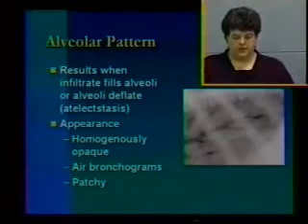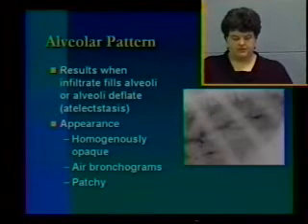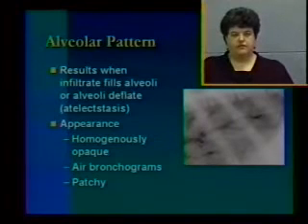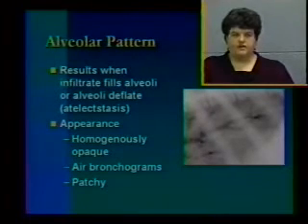Alveolar pattern is probably the easiest to identify and probably has the shortest list of differentials. An alveolar pattern results when infiltrate, either fluid or cells, fills the alveoli or air sacs. Or it can occur, like we discussed earlier, if the alveoli deflate and there's atelectasis.